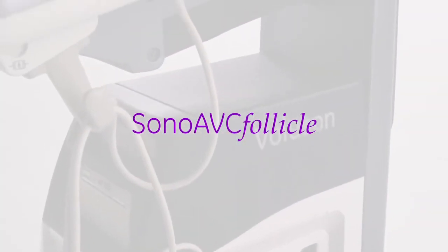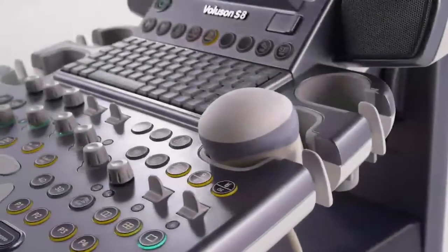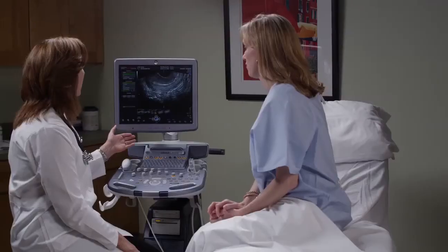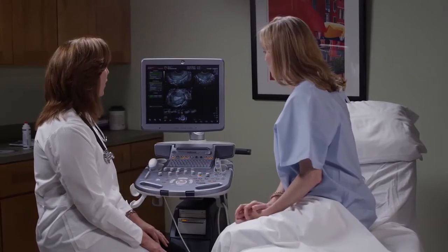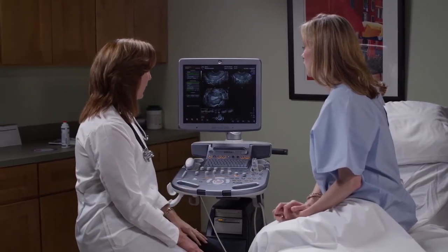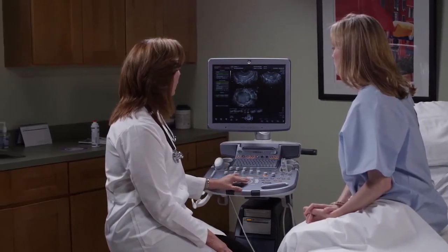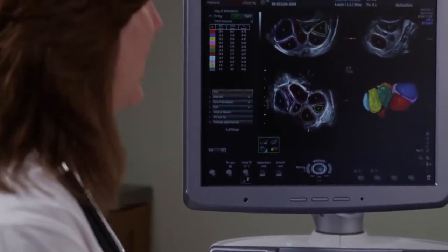2D ultrasound has been used in the assisted reproductive medicine environment for many years to assess for uterine and ovarian anatomy, pathology, and follicle monitoring. The introduction of 3D imaging provided access to new imaging planes not accessible with 2D imaging, further enhancing the evaluation of uterine anomalies and pathology. 3D ultrasound can also play a key role in follicle monitoring.